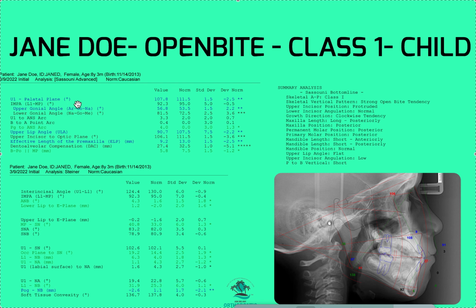Okay, so that is actually normal. So these teeth are normal. That tells me I could flare if I needed to. I have some flexibility in the position that I put those lower incisors, so that is important. What else is good here? One thing that they really highlighted here is the dentoalveolar compensation. They put 5 stars. That's basically meaning that the teeth are either extruding or leaning forward to try to compensate for this open bite. They're going in a position that really isn't that healthy. So that's telling you that something's going on with the growth there.